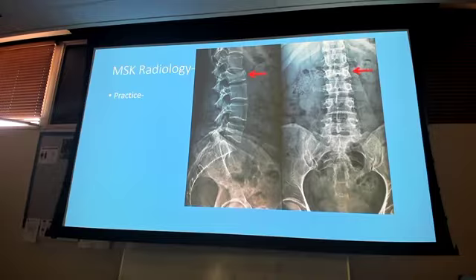What do we got going on here? Compression fracture. Good. Notice how the bottom of the vertebrae looks pretty normal. I don't have any major issues with that. But then up here, I'm smushed down a little bit. Look at the size of my vertebrae on all the other ones. And then this one is shorter, smaller. Got that compression fracture. Definitely osteoporotic, right?